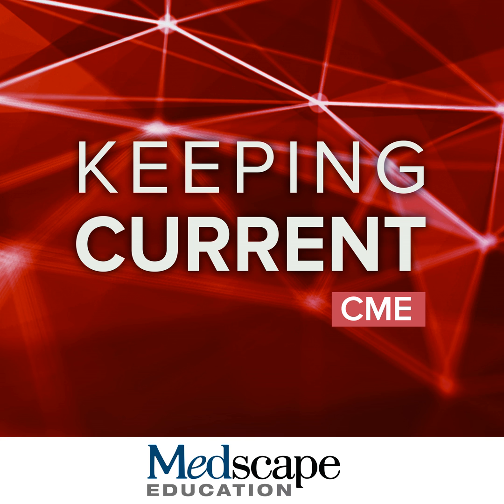We can speed up this acquisition significantly with this compressed sensing approach. This allows you to essentially denoise the real-time acquisition. As you can see in this other set of images, these are real-time cine images of the heart with much sharper and much better image quality. These are carried out free breathing now with a frame time of approximately 50 milliseconds, which is comparable to the approach that we take with standard cine segmented imaging.